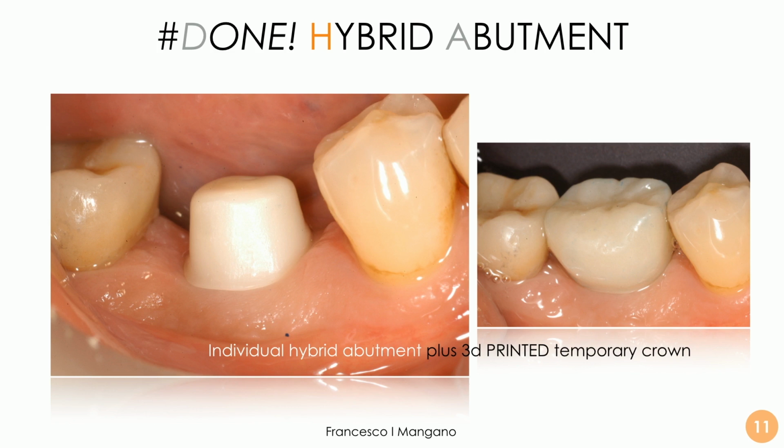The individual hybrid abutment is the definitive one, the final one. So basically with this system that is a screwless implant abutment system, similar to the Bicon system. This system is the Leone implant system. You don't need to screw it, but you place it in position.